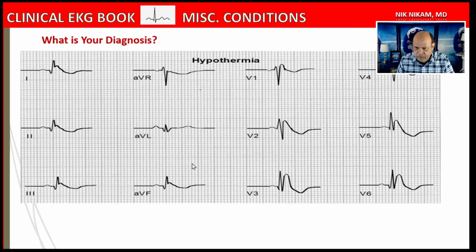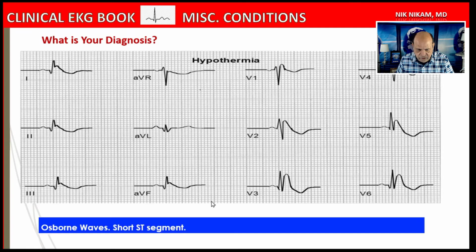Okay, hypothermia. Hypothermia sort of mimics the picture of hypercalcemia. You see the short ST segment with an Osborn wave with a downsloping T wave, inverted T wave, and these are some of the features of hypothermia, short ST segment.